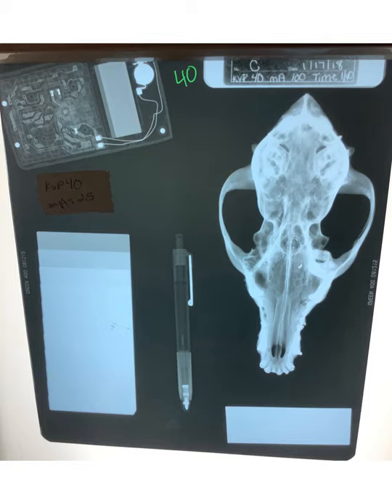So here we had a 40 kVp, a relatively low force of kVp hitting it. And right over here is where we have our thinnest portion of metal of the step wedge. So if we look at this and count how many steps we can see, I can probably see 1, 2, 3, and then these all blend together. So we cannot see too many steps. We had a pretty low force. We had enough force to get through these first few steps. But by the time we got up here, we just didn't have enough force. So all you see is something that looks white.